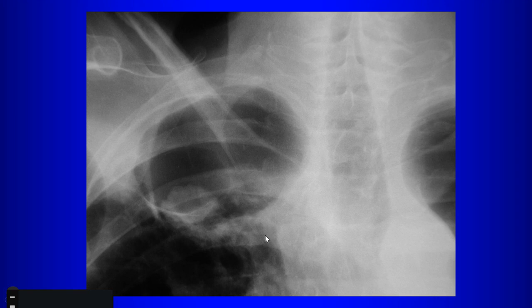There's a large bulla here, right? There's this large lucency, which in this case is a large bulla. Anything peculiar about it? Well, what do you see? Yeah, there's this dependent nodular opacity within this large air collection, right? So this dependent nodular opacity you suspect represents a fungus ball or aspergilloma. Is there a way to prove it? How could you prove it?